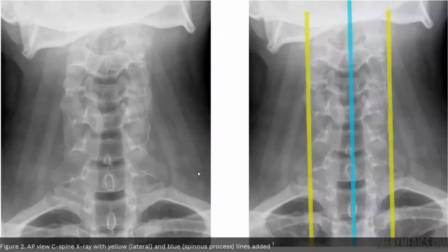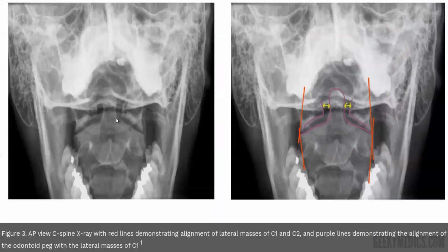And what about this view? Odontoid view. Open mouth odontoid view. Okay. So is this normal or abnormal? Normal. Accurate or inaccurate? Accurate. No, not accurate.